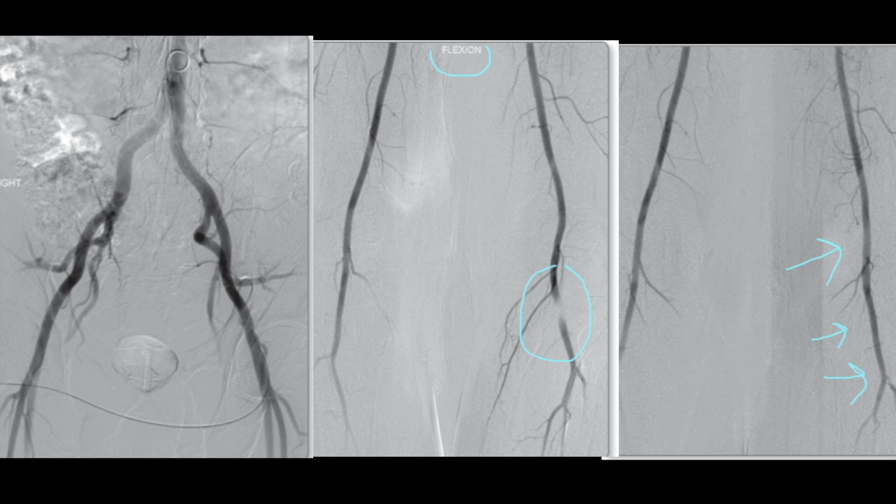For those interpreting catheter angiograms, it's important to note some key points. First, describe the study comprehensively, including the access point and the specific vessels being examined. Also, check for any annotations that might provide additional context. Look carefully for any catheters or balloons that could indicate previous interventions, such as stents, embolization coils, or grafts. When comparing images, pay attention to any abnormalities or deviations in the normal filling of vessels. This can help identify complications like pseudoaneurysm, dissection, or embolus.